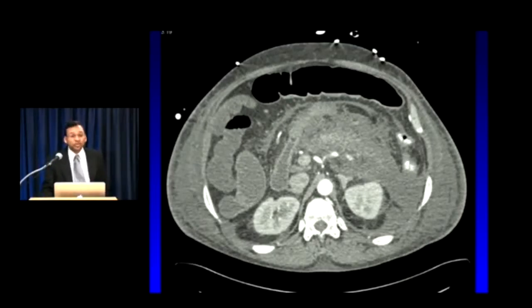You're going to see usually what looks like a massive phlegmon surrounding the pancreas. You may have trouble finding normal pancreatic parenchyma, and you're going to see this ill-defined hypodensity, fluid, and inflammation replacing where you'd normally find pancreatic parenchyma. Now in this case, you can see that there's a big phlegmon in the retroperitoneum. There are certain areas of the pancreas that look like they're enhancing normally, but frankly, I can't find much of the tail segment, can't find much of the head segment. So this is a patient who probably has 30 to 50% parenchymal necrosis.